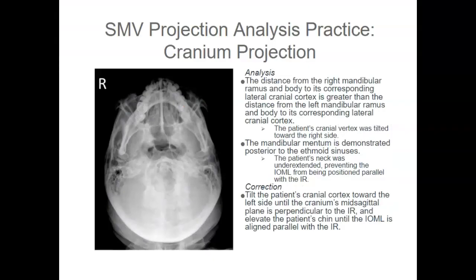So let's review an SMV practice analysis of the cranium. First, we want to look for tilt, rotation, or any mispositioning with the IOML.